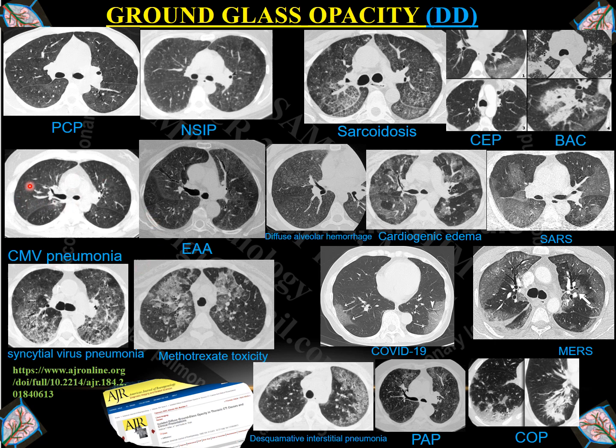Cytomegalovirus pneumonia also shows ground glass opacity. Extrinsic allergic alveolitis or hypersensitivity pneumonitis can show ground glass opacity plus centrilobular nodules also. Diffuse alveolar hemorrhage, which can occur due to diseases like Wegener's granulomatosis, can also show ground glass opacity with a fluffy pattern appearance like this. Cardiogenic edema shows ground glass opacity in the lung with enlarged cardiac size, as well as Kerley's lines and pleural effusion.